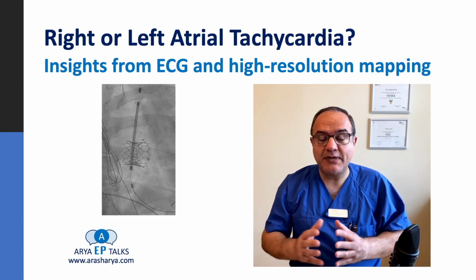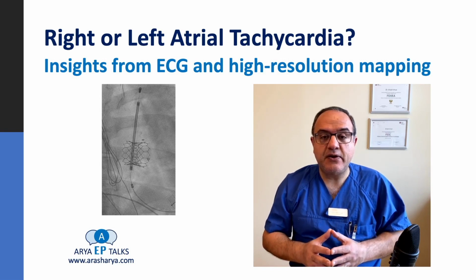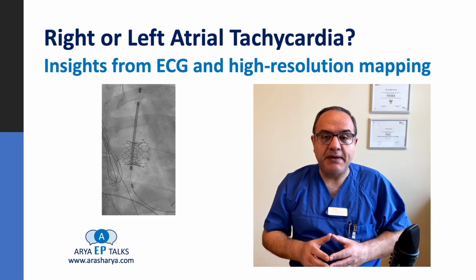Today we will discuss together the ECG findings and also high resolution mapping of the right and left atrium in a patient who received inappropriate ICD shocks due to a supraventricular tachycardia.